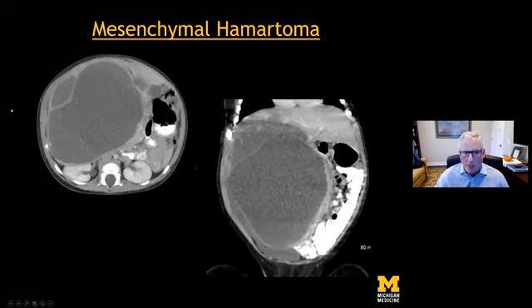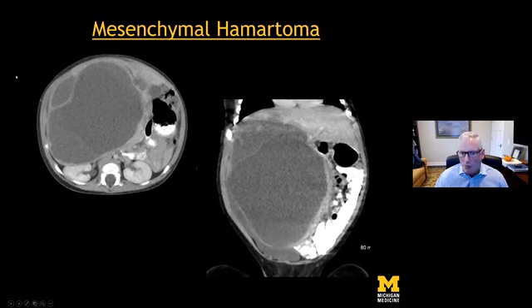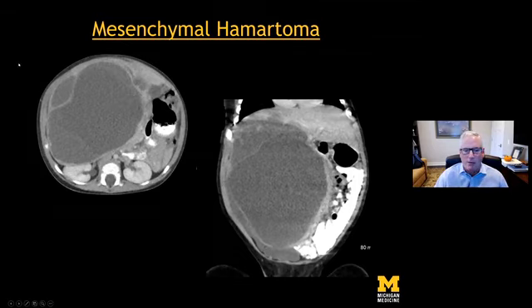We recently had a patient that had CT imaging that showed a very, very similar lesion. Cystic with septal enhancement, thin imperceptible wall, and you can tell it's a very, very young child, just several months old. And this was a mesenchymal hamartoma at pathologic diagnosis. So again, cystic, they can be solid, but cystic and young patient, very little solid enhancing components. These are all the things that you want to think about with mesenchymal hamartoma as a potential liver lesion.